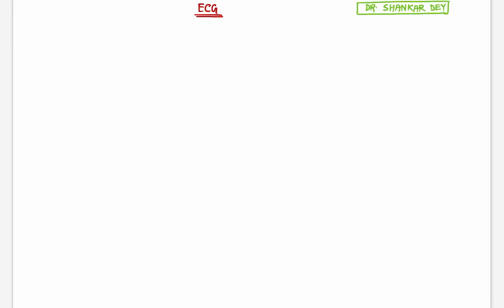In this class of ECG, we are going to discuss abnormalities of QRS complex in ventricular hypertrophy. So today's topic is abnormalities of QRS complex of ECG in ventricular hypertrophy, in left ventricular hypertrophy and right ventricular hypertrophy.